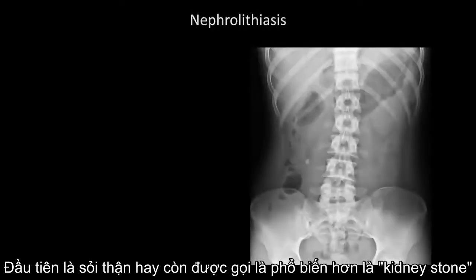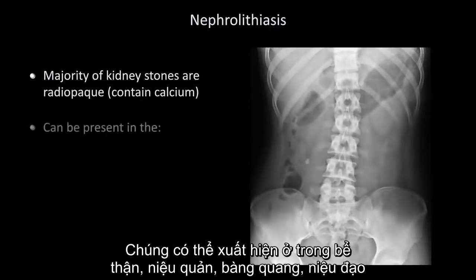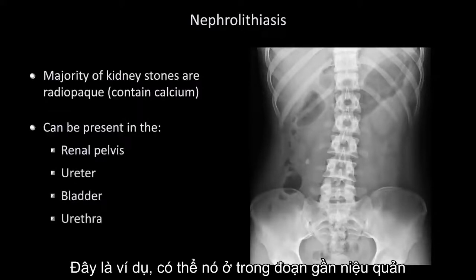The next major category of abnormalities is calcifications, the first of which is nephrolithiasis, more commonly known as kidney stones. The majority of kidney stones contain calcium and so are radio-opaque on X-ray. They can be present in the renal pelvis, ureter, bladder, or urethra. Here's an example of one probably in the proximal ureter.